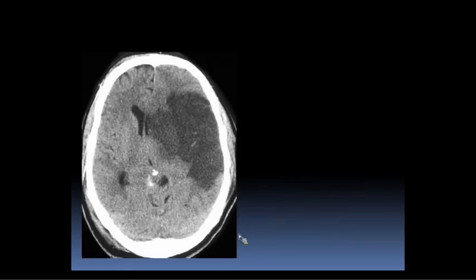Okay, this is clearly an MCA infarct. This is not sparing the basal ganglia. This is really kind of involving the entire MCA territory at this point. You can tell that this did not occur just today because there's already so much mass effect. There's midline shift. There's the effacement of the lateral ventricle. So this is acute to subacute at this point.